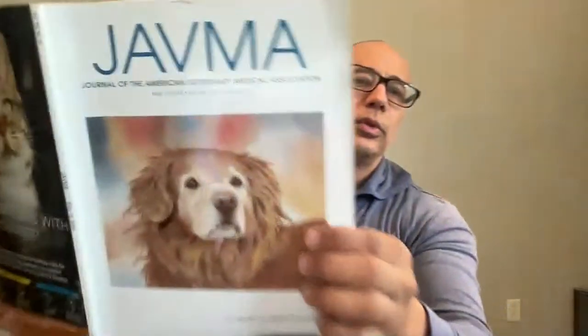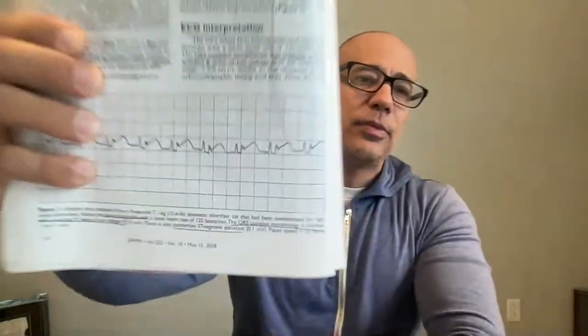We are going through this issue of JAVMA. This is the May 15, 2018 issue. We are talking about the ECG of the month. These are always tough because they are based on pictures, these ECG strips that are here. I don't have a good way yet of pointing this stuff out, but also cardiac disease is difficult, not my strong suit. So a lot of this is going to assume that you know some basic to moderate level of cardiology, and I'll try to explain things as we go.